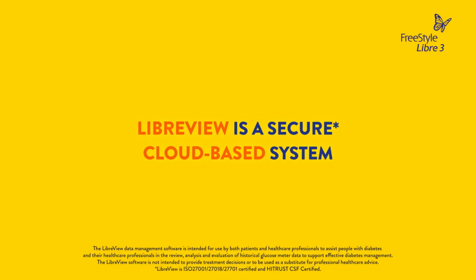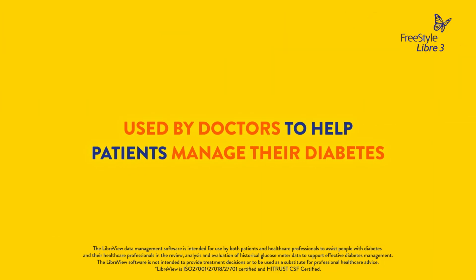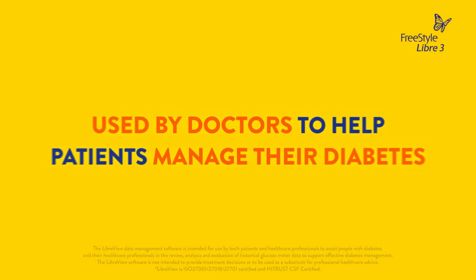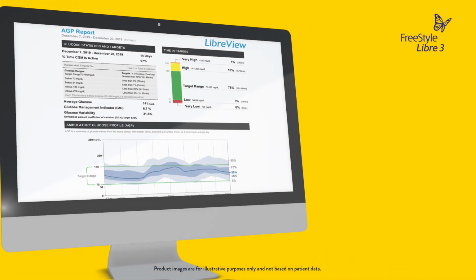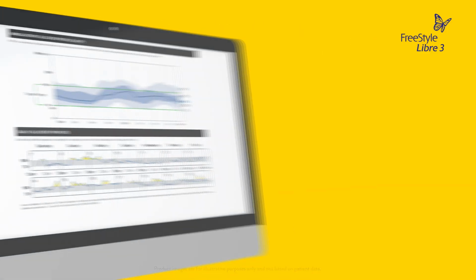LibreView is a secure, cloud-based system primarily used by your doctor to manage patients on the FreeStyle Libre family of products. Once you're connected, they receive your glucose information in the form of clinical reports, which they can use to better understand how to help you manage your diabetes.